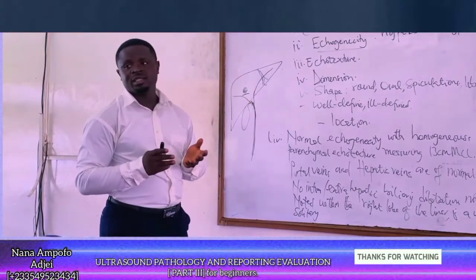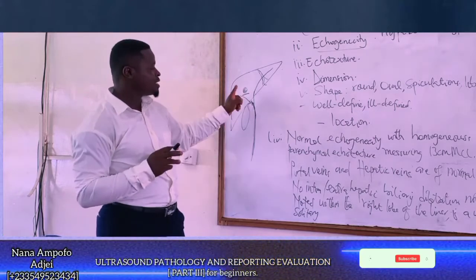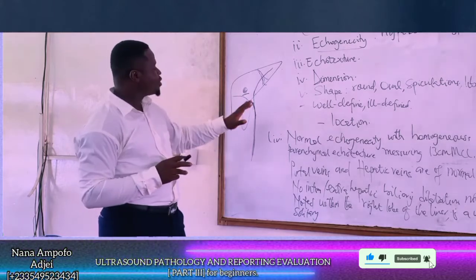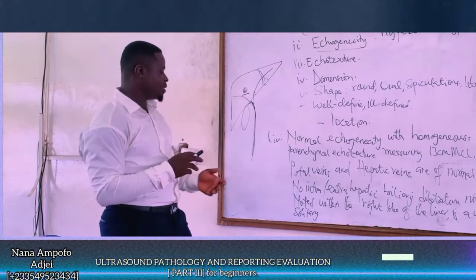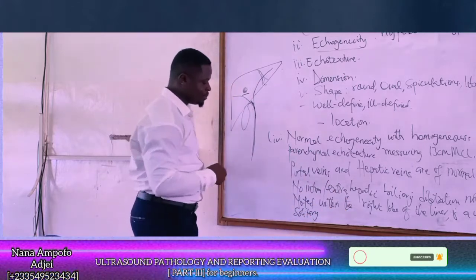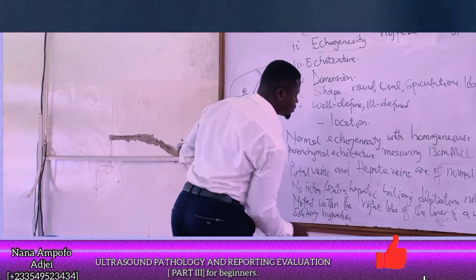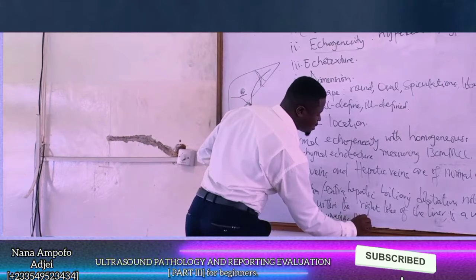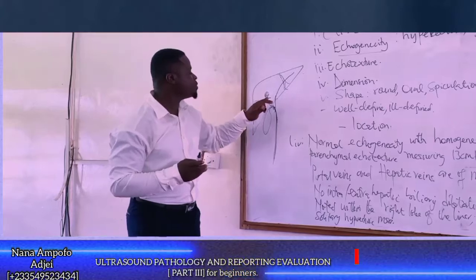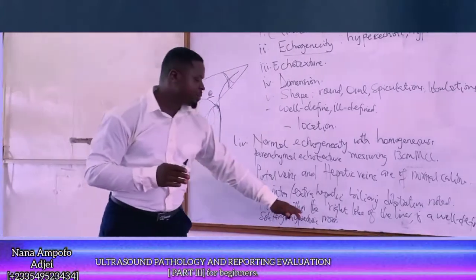What is the echogenicity? Is it hypo or hyper? Now we are describing: you are seeing this part, and I am also seeing this hypoechoic because it is dark here. Okay, solitary hypoechoic mass. Why mass? Because we said they are space occupying lesions, they are occupying the space inside the liver or the organ.